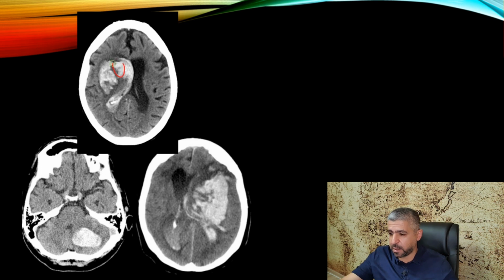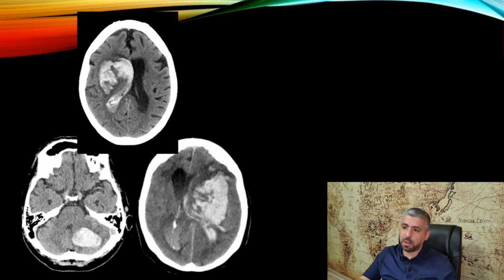You can see here, again, it's in the basal ganglia, extending to the ventricle, to the occipital horn, and it's going into the brain parenchyma, a large intraparenchymal hemorrhage or hematoma, and all of them show a swirl sign, very obvious because of the hypo and hyperdense mixture.